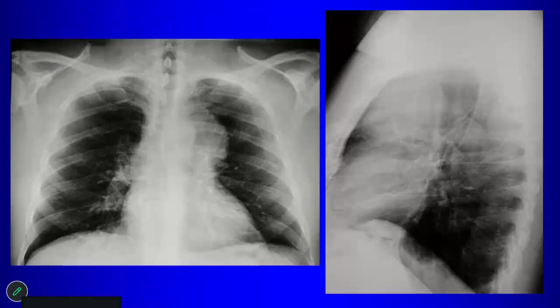Why don't we like thyroid for this? One, it's not pushing against the trachea. Yeah, it's not deviating the trachea, and it doesn't look like it's extending down from the neck. All right, so we don't like thyroid for this. So we've started with thymoma. What is the differential for anterior mediastinal masses? The classic is thyroid, thymoma, terrible lymphoma, teratoma, so we call that the T's.